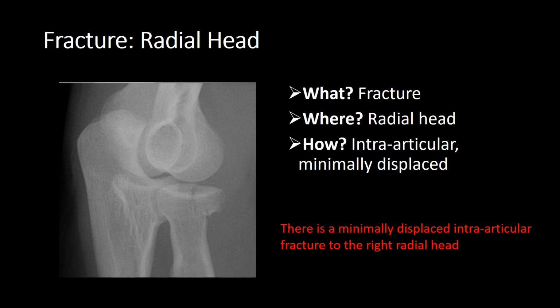So what is it? It's a fracture. Where? Radial head. How? Intra-articular and minimally displaced.